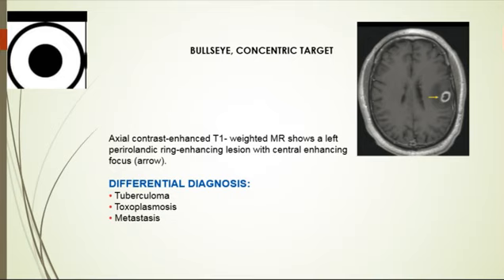While the deeper parenchymal region may demonstrate a more concentric appearance. So the deeper you go, the more central or concentric the pattern. And this is specific for toxoplasmosis, corresponding pathologically to central hemorrhage. Okay, good.